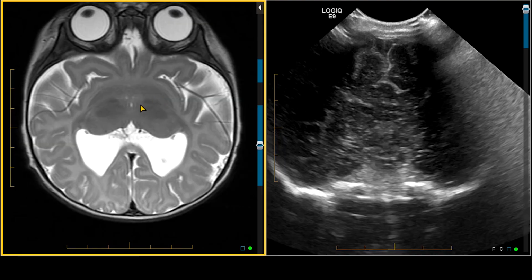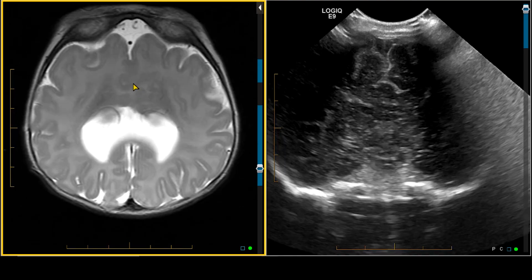An MRI is performed showing some fusion of the thalami, which is a diencephalic structure, and anterior midline continuity across the expected location of the interhemispheric fissure anteriorly. This corresponds with the appearance on the ultrasound. We also see a single, or azygous, anterior cerebral artery right here. Posteriorly, we see a falx cerebri, and we see two separate occipital lobes. So this patient has some features of holoprosencephaly, but it's not as severe as the alobar holoprosencephaly that we saw.